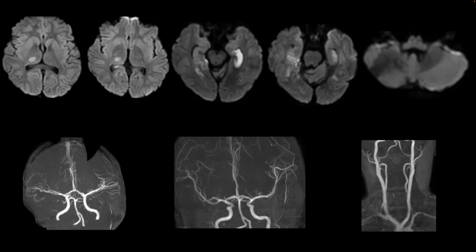So I'm not sure, because in this patient you've shown some occlusion of the PCA. I could not see anything. Usually we don't see it on the MIPs, but yes, cannot appreciate the PCA. And that also keeps changing in the subsequent scans. Sometimes it appears over a period of a year. So inflammation of the artery, that's fine, COVID, but why should you have another stroke after a year?